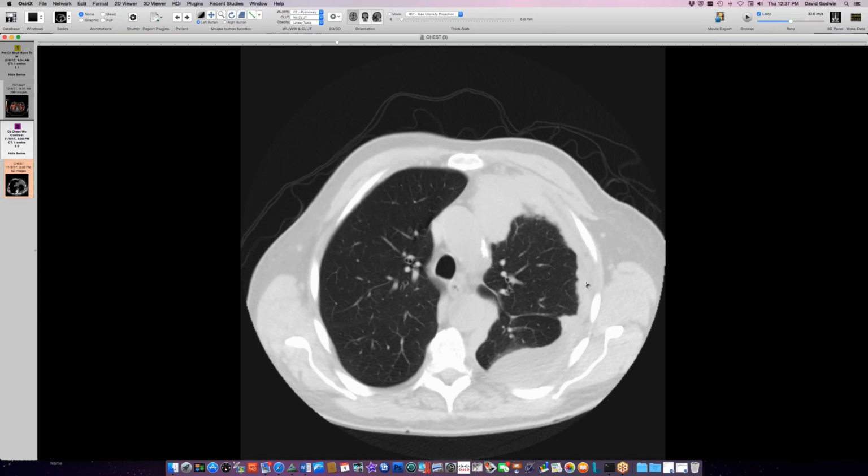Instead, the findings are in keeping with a sarcomatoid carcinoma from the lung that has invaded the pleura. And this process is known as pseudo mesothelioma. It's a growth pattern that mimics mesothelioma. And the presumptive mechanism is that there's a very peripheral lung lesion that invades the pleura and basically grows in the pleura, but the lung nodule just sort of empties into the pleura, and you don't appreciate the lung primary source of this.